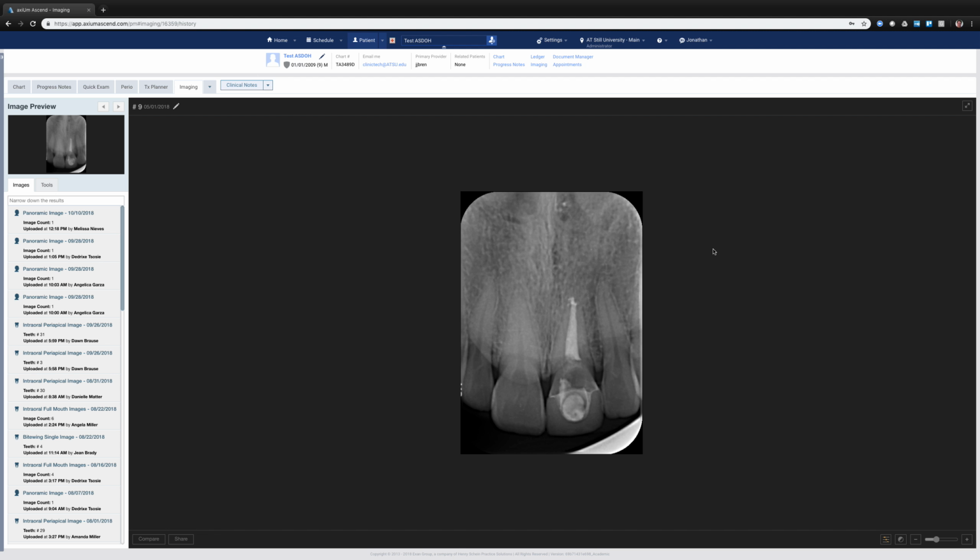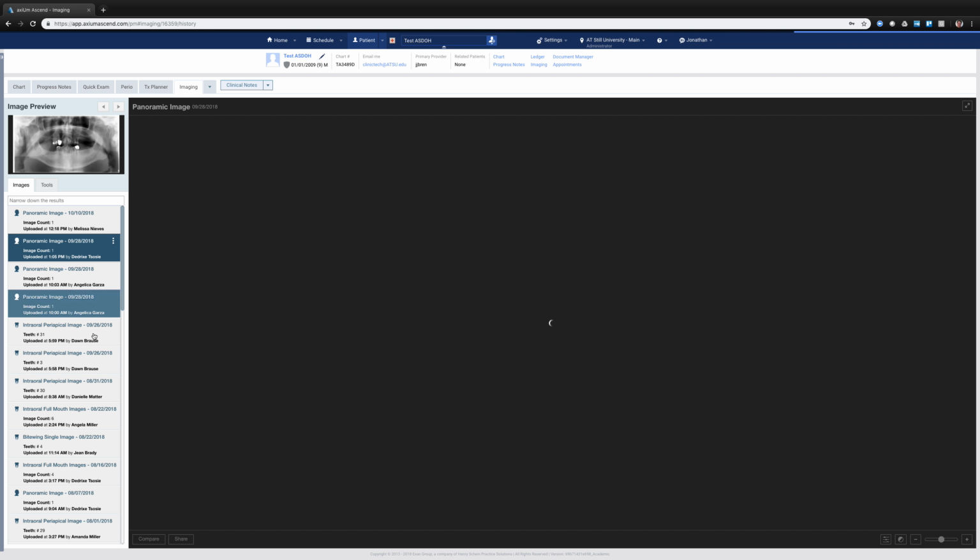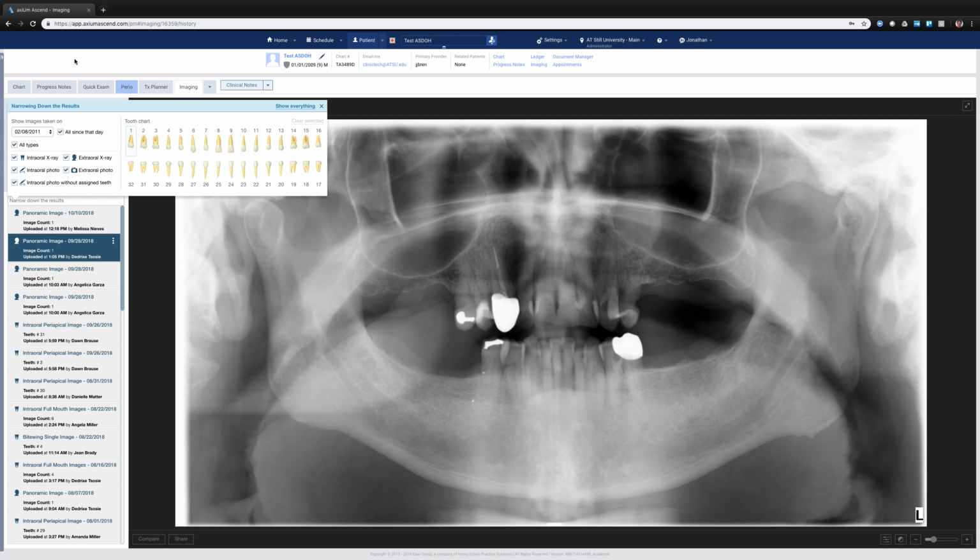This is Dr. Johnny Brennan again, going through just a couple quick tips for axiUm Ascend. I pulled up a test patient, and again, we're in the imaging section. There's a different tutorial where I talked about narrowing down the results with filters that we're going to use a little bit, but you can watch that one to learn a little bit more about how this works.